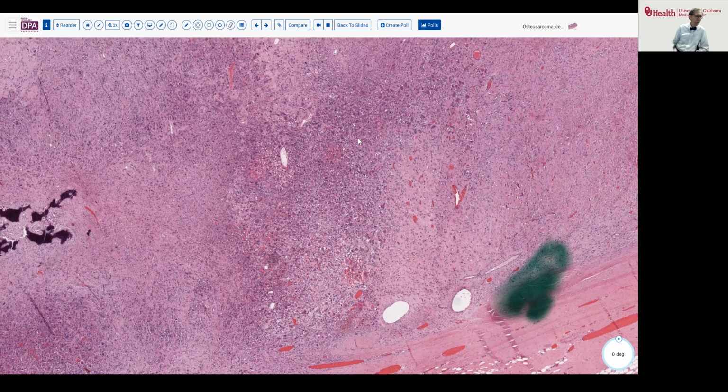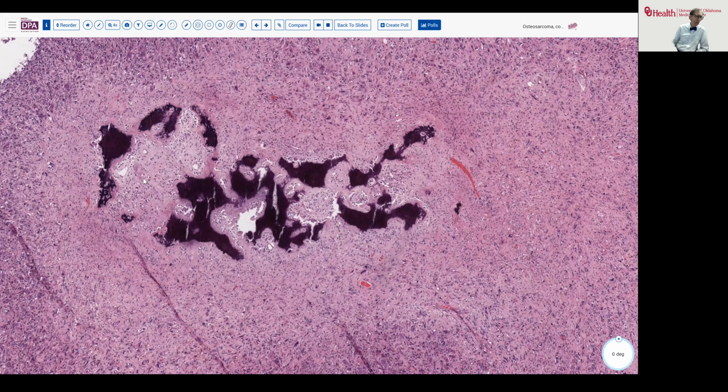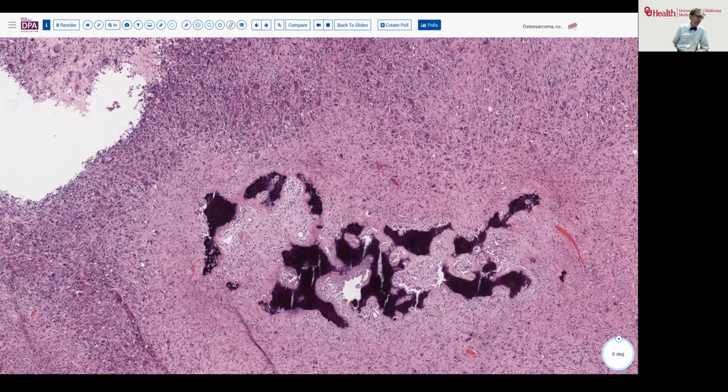And then we have over here, obviously, some calcified tissue, so some bone. And this then raises the question, well, is this tumor bone, or is this related to his fracture, or is this other sort of bone? And I think there's a helpful clue here, which is one of the teaching points in this slide.